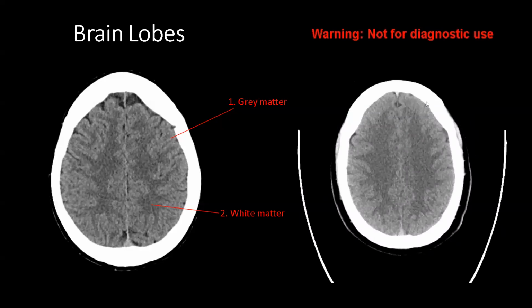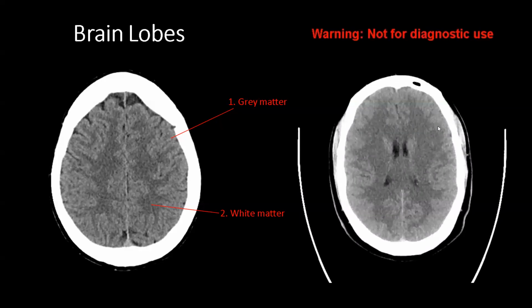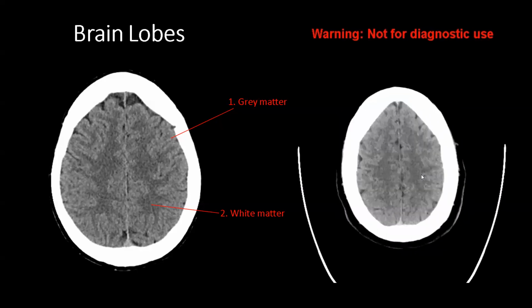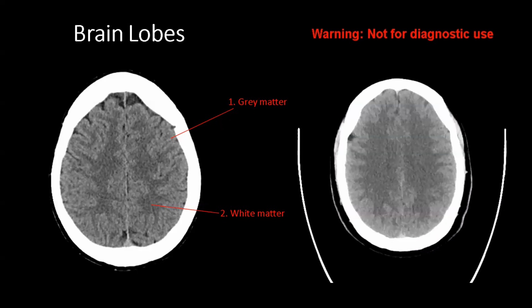with quite a full brain and really healthy looking cortex. You can see a pretty thick layer of nice white, uniform, and bright, dense cortex, making up the gray matter of this patient's brain. And then there's a pretty well-defined junction here between the gray matter and the white matter. And then centrally, you can see all this white matter branching out to the cortex. So this is what a normal gray-white differentiation looks like. It's important to know the difference between gray matter and white matter because it becomes very important in stroke imaging. Because one of the key findings of stroke is we start to lose that gray-white matter differentiation.